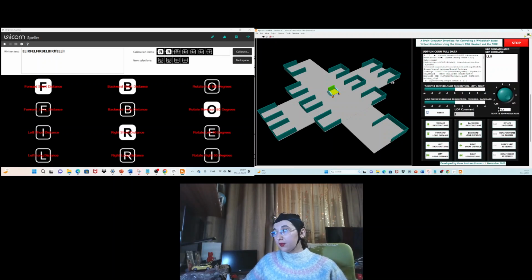Okay, let's begin. This is the first command.